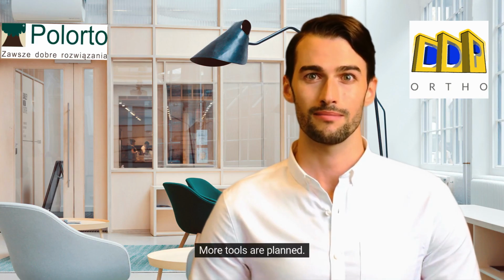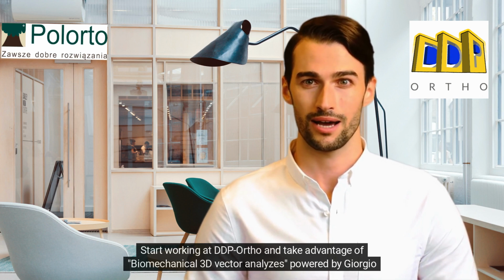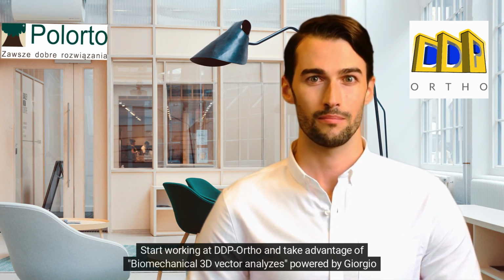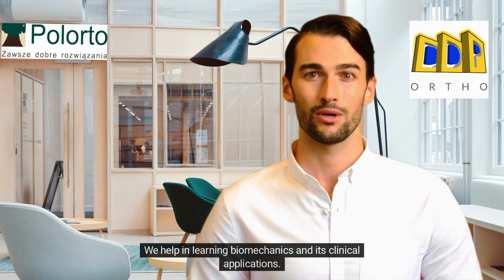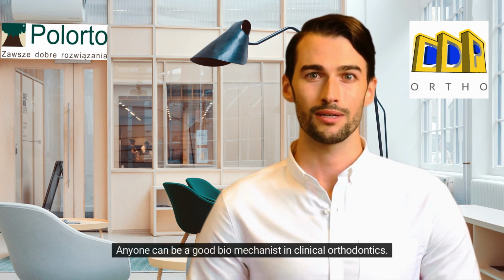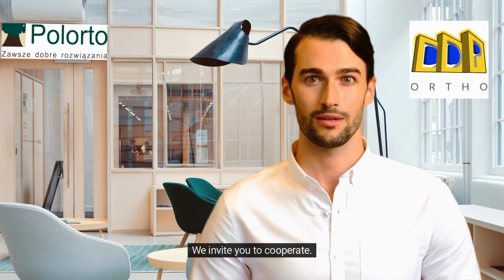More tools are planned. Start working in DDP-Ortho and take advantage of biomechanical 3D vector analyses powered by Giorgio Fiorelli. We help in learning biomechanics and its clinical applications. Anyone can be a good biomechanist in clinical orthodontics. We invite you to cooperate.